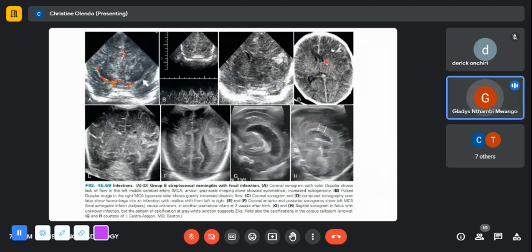So the echogenicity in the ultrasound was because of what? I see in your legend it was hemorrhage, right? So it was actually hemorrhage that was causing that. But beyond that, you can see the sulci are not well defined in the ultrasound. You can see the ventricular system is compressed, especially on the ipsilateral side. Yes, the ipsilateral frontal horn is compressed. There's actually a midline shift.